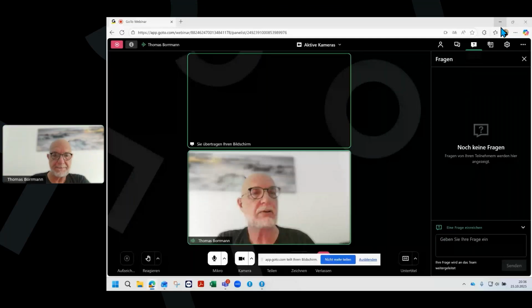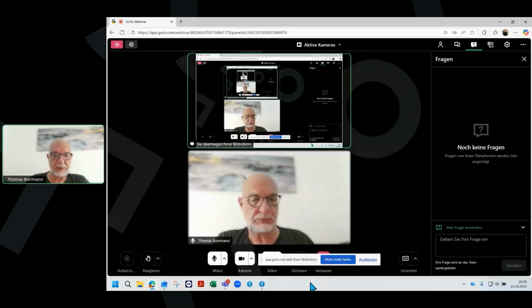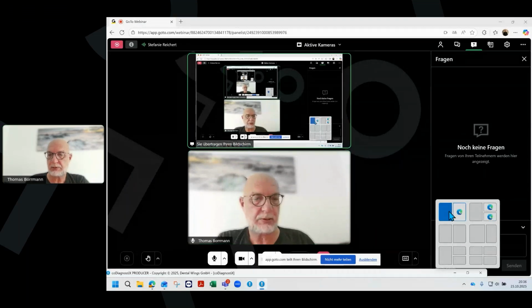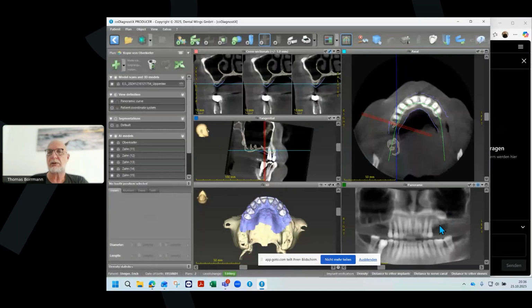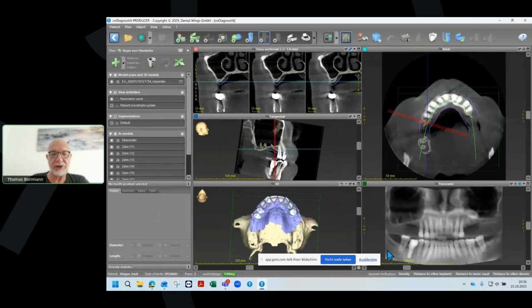That's strange. Ah, okay, I understand. Oops. Okay, we're just seeing your copies. Okay, now we can see your coDiagnostiX. Can you see my coDiagnostiX?